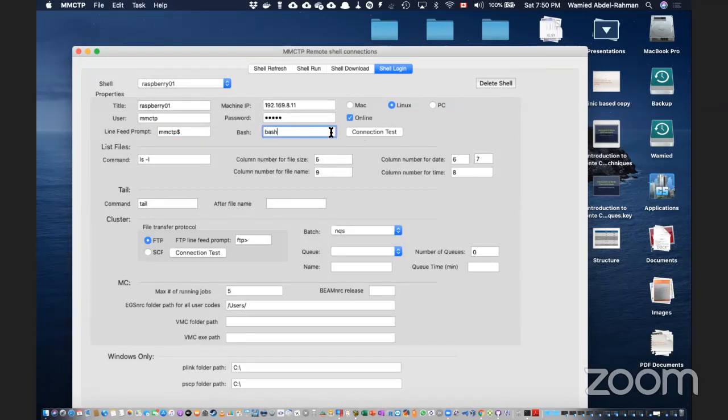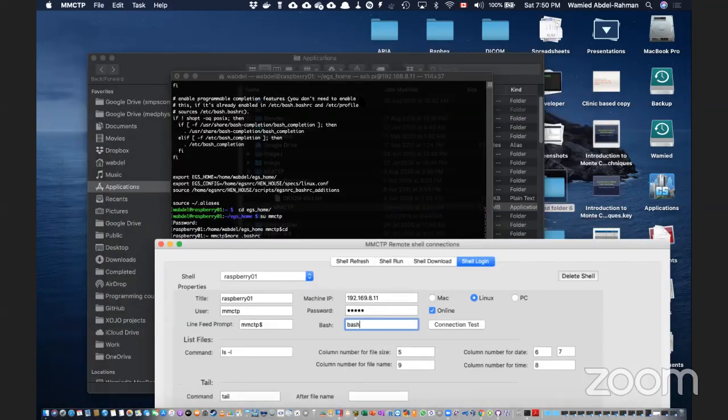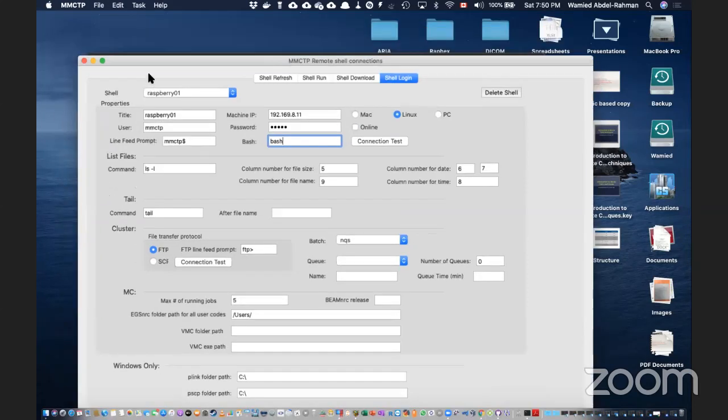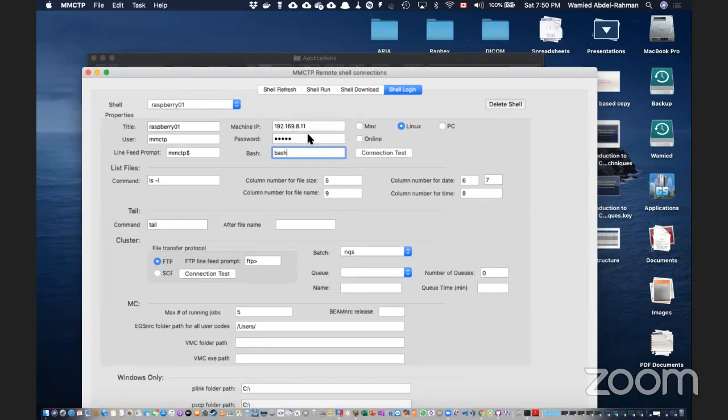MCTP, that's fine. Okay, why is this? Oh, okay, now I know why, because this is 168. That's the reason. Okay, so now I should get an OK.